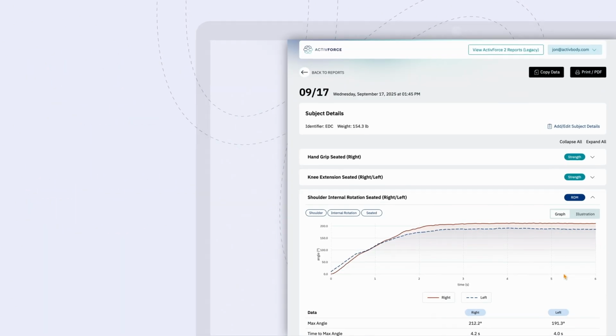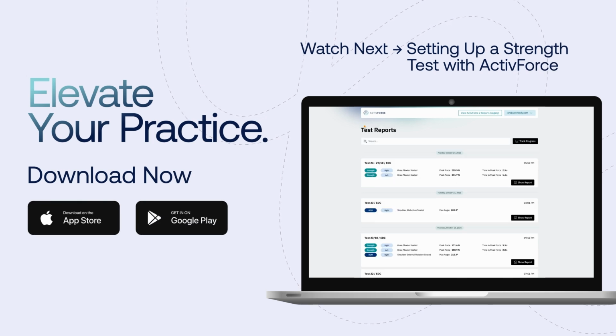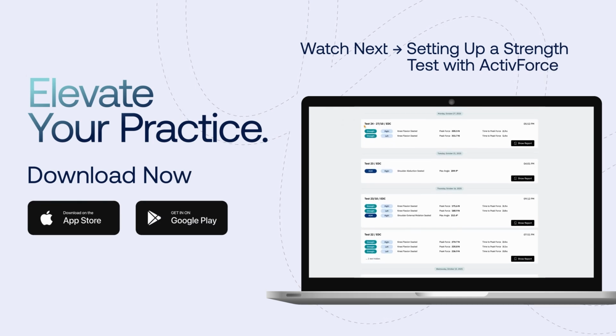The ActivForce Dashboard turns every test into a clear, actionable report, making data easy to interpret, share, and apply in practice.